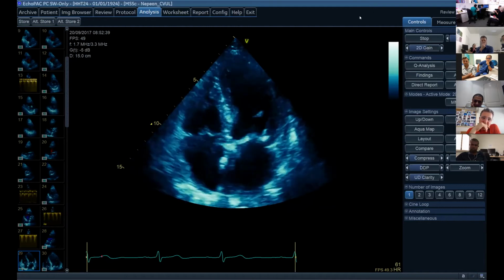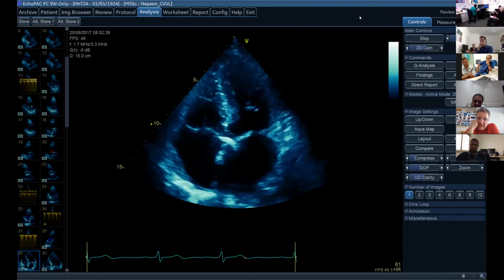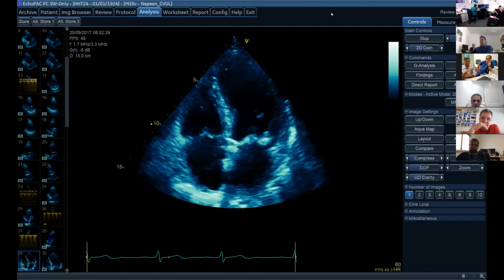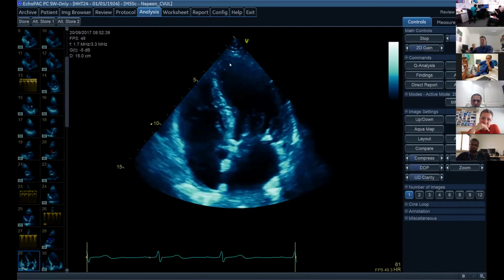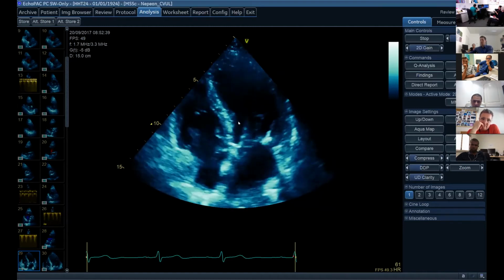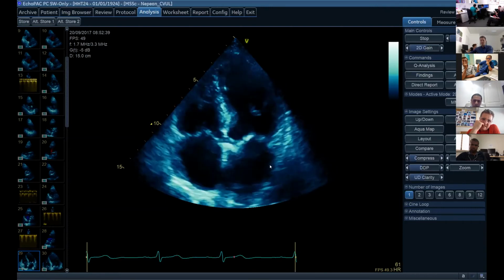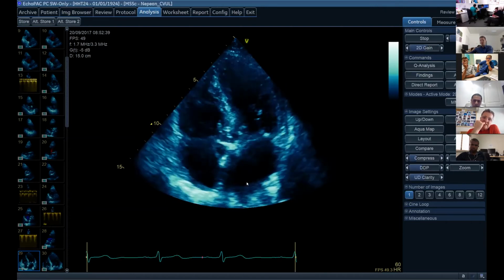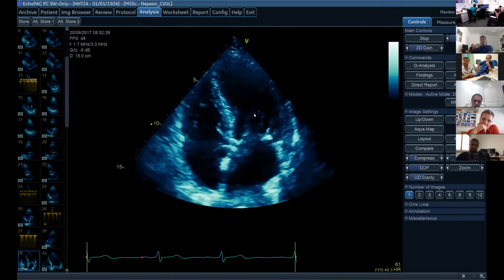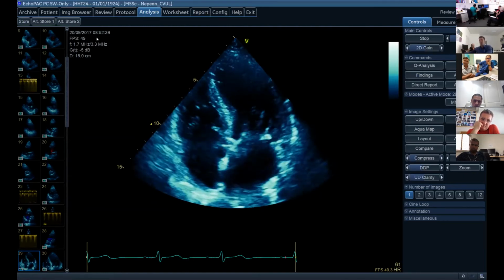And so it's not adding much, but it's just confirming the diagnosis and the state of flow that we're expecting. Yeah, that really is good. Again, seeing that underfilled ventricle, very small end systolic volume, horrible calcification we're seeing in here. Interatrial septum, as you're saying, pushed over to the right, significantly raised left ventricle end diastolic pressures, even though the left ventricle is still underfilled, all pointing towards significant stenosis that we're looking at.